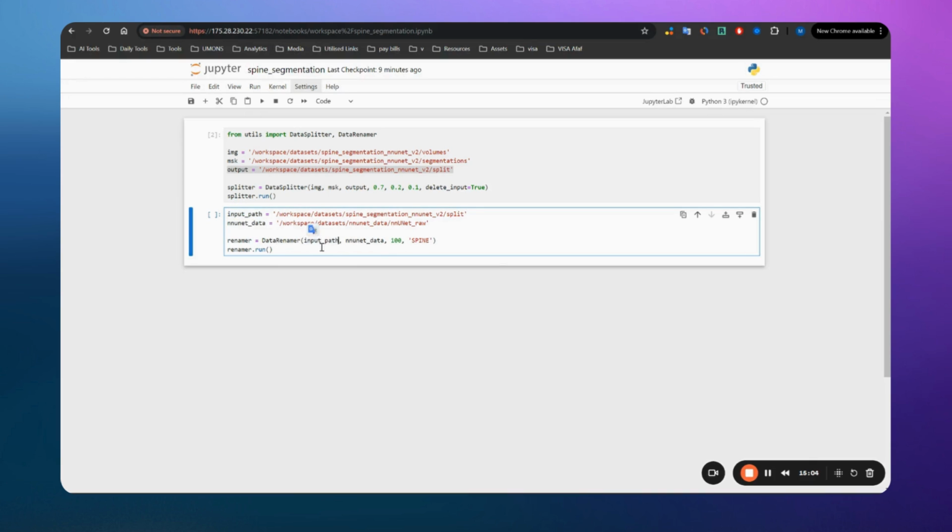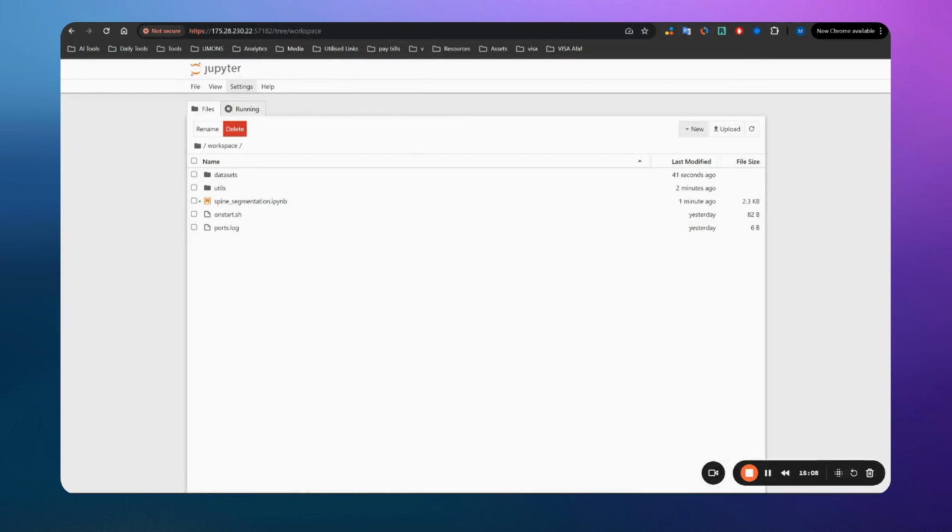It should take the input folder that will contain the images, like for the training, validation, and testing, because you need to use the splits. The script that I am using here, which is the renamer in the utils, is waiting for the images. Let me just open it here. I built it so that it will be used just after the splitter.